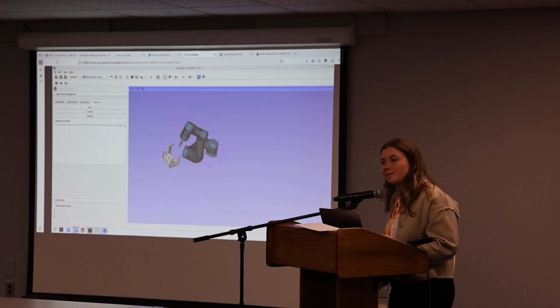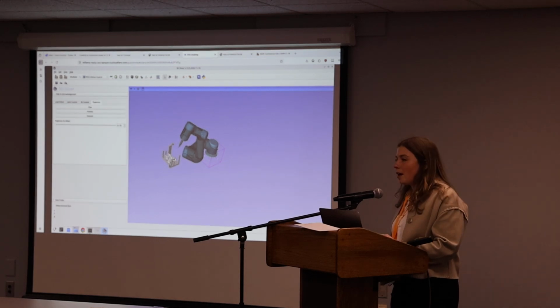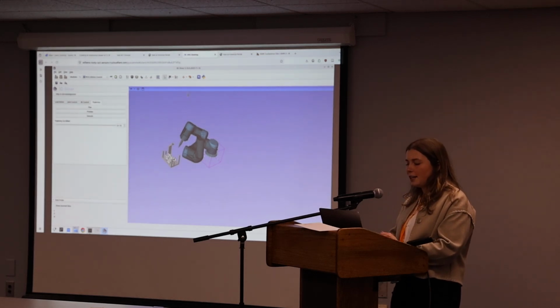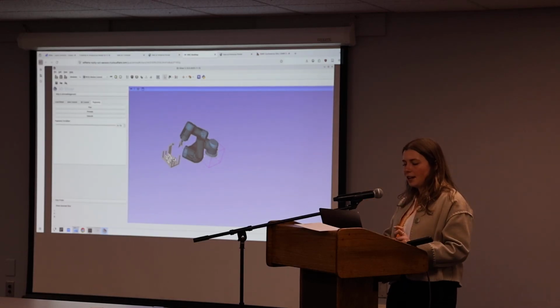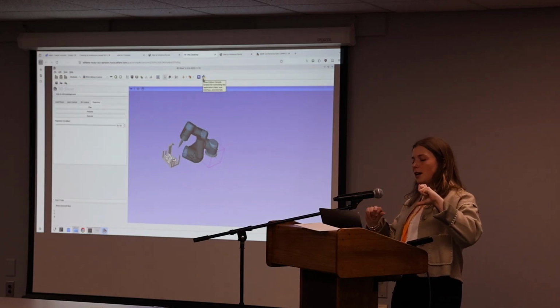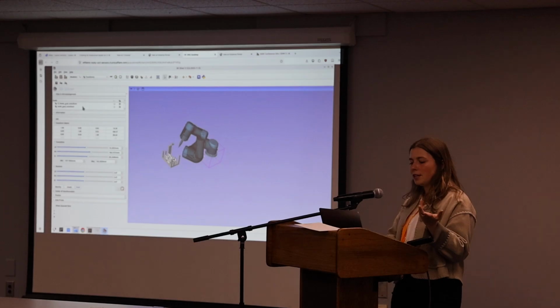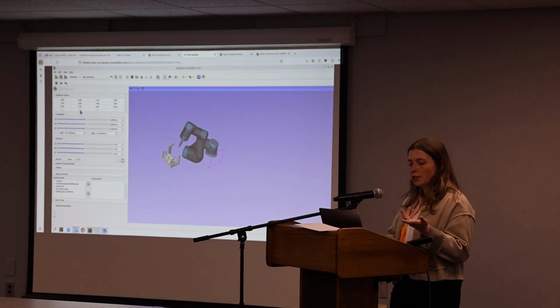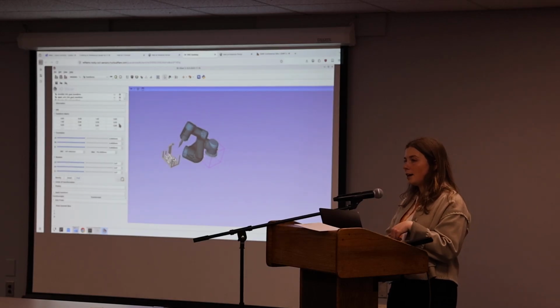Is there a way to click a point instead of trying to get it to look like you're there? Yeah, I think it would be more programmatic. You could set the position of this end effector pretty easily by grabbing the transform and setting the X, Y, Z in Python. So if you had a list of fiducials, you would take this transform, which is just like all of the TF2 lookups coded as normal transforms. You'd basically set the X, Y, Z to be whatever that point coordinate is.